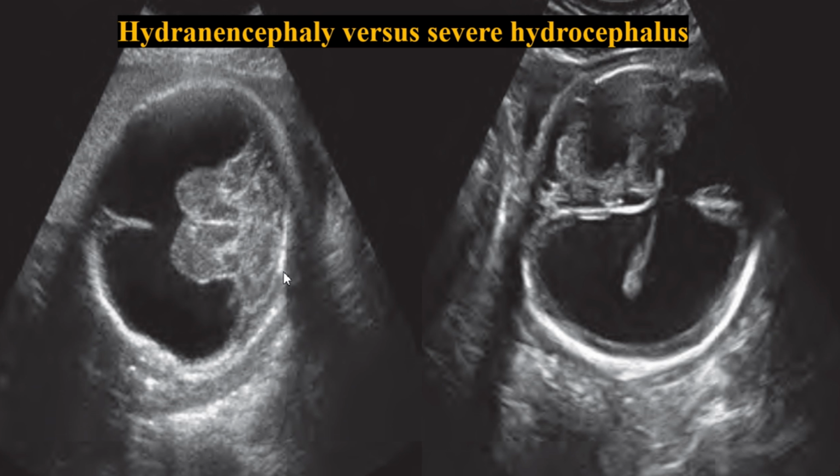And now we are going to discuss the comparison of hydranencephaly versus hydrocephalus.